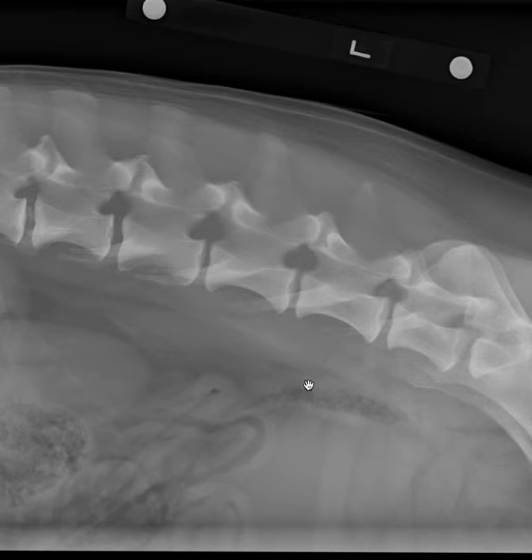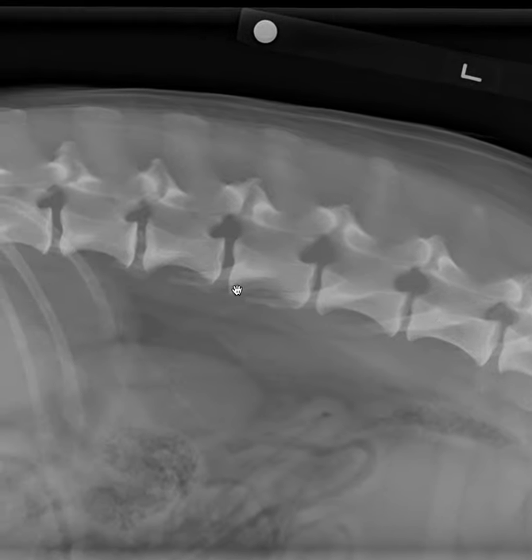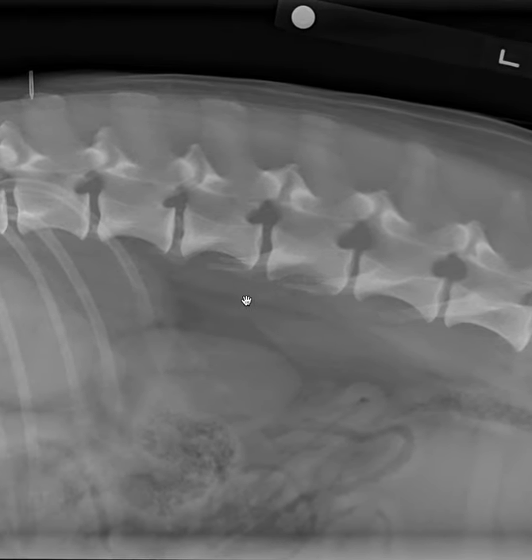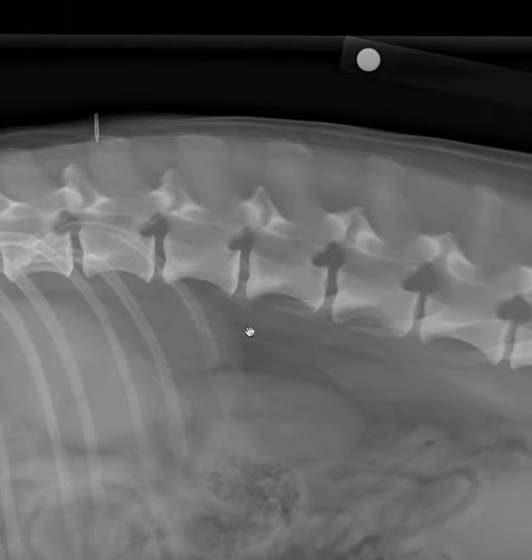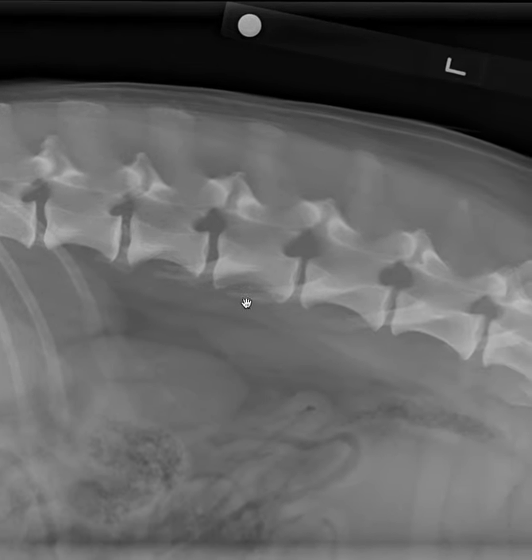Very early aggressive lesions of the spine can be much less obvious radiographically than what we've seen with limbs. So what you want to see is that the overall opacity of the structures is quite similar for each vertebrae, that one isn't substantially more radiolucent, which could support bone lysis. Lastly, the vertebrae have many different anatomic features, and I try to assess each of them. So this would include things like the spinous processes and the transverse processes that I look at along the way.